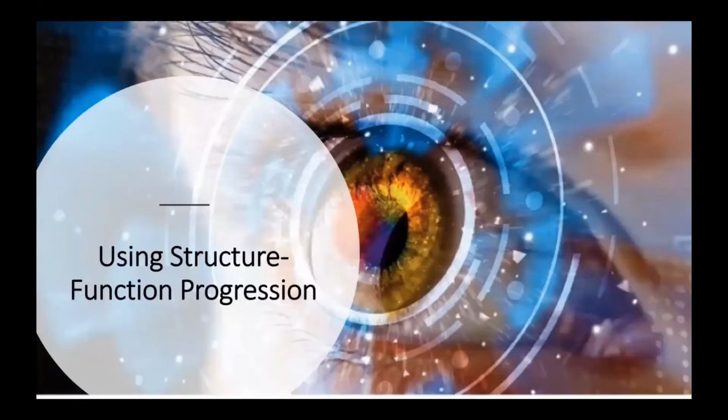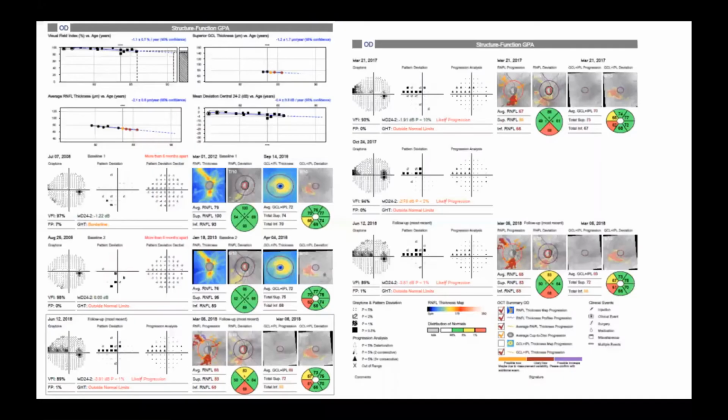We can use our reports, our structure function reports in Forum. This again being Mr. Garcia from the very first time that we saw him back in 2008 or 2009. And we can see that we have change in our visual field. We have change in our nerve fiber layer thickness.